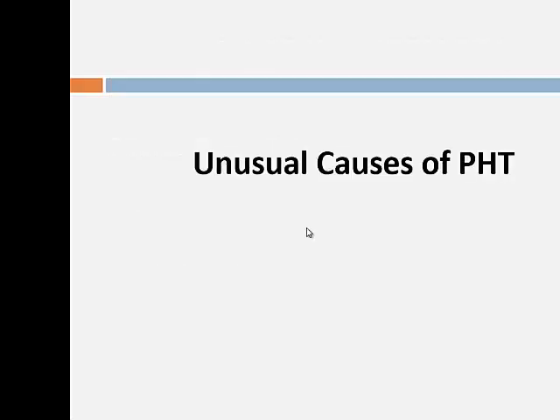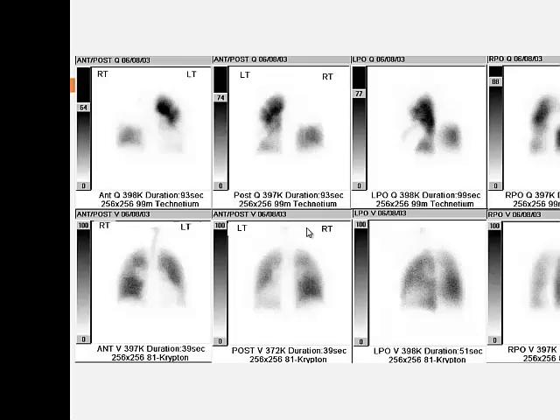So unusual causes of pulmonary hypertension. Let's have a look at this. What would you say on this VQ scan?